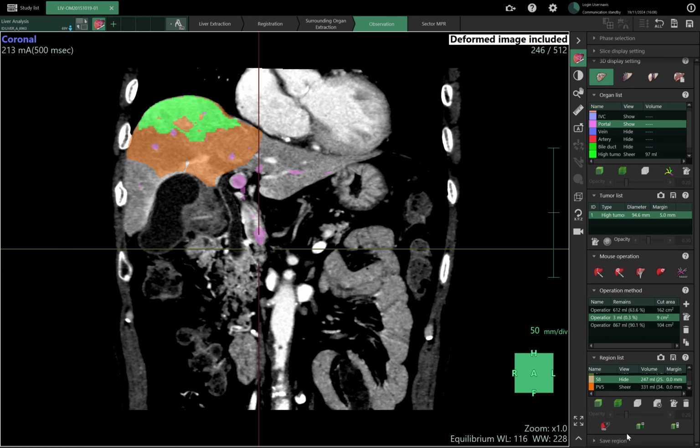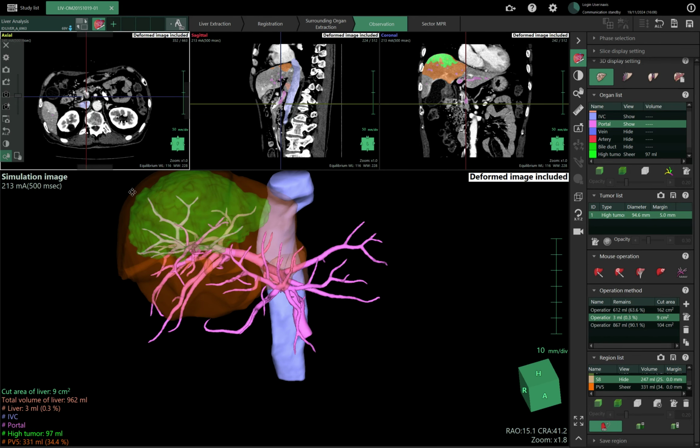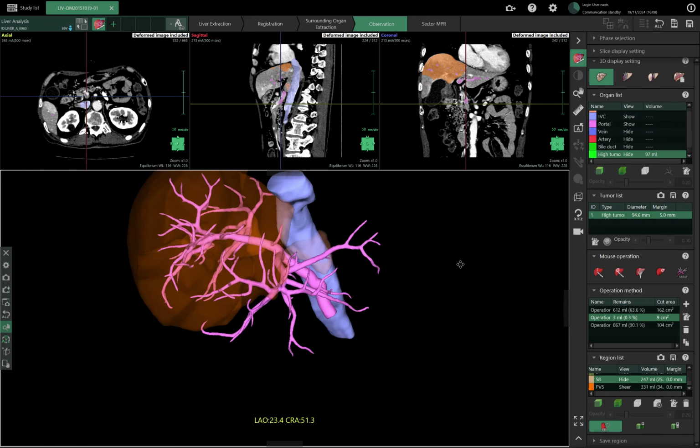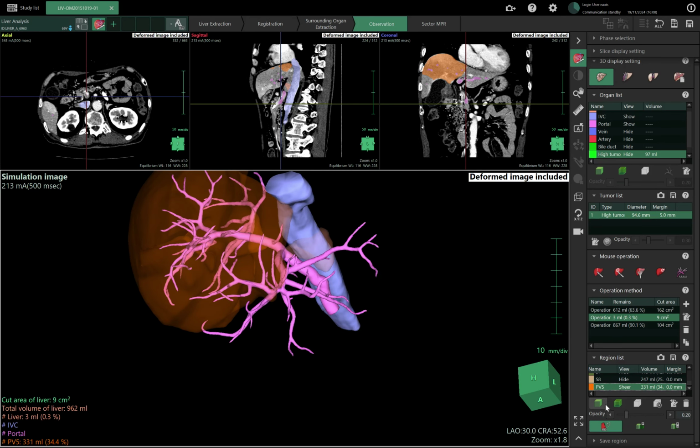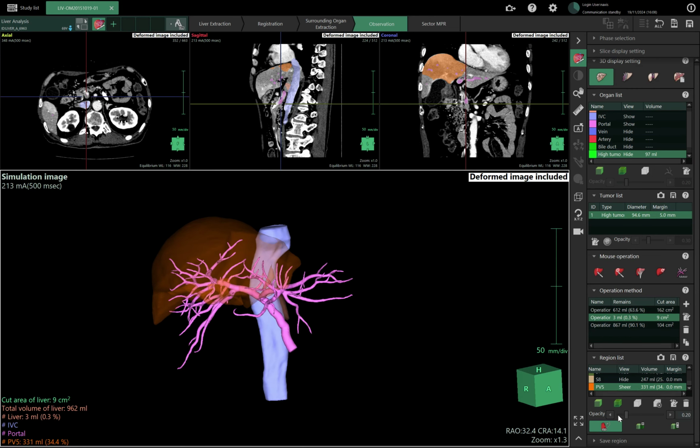Okay, so the rest of the application is more or less the same. This is just for matching the visualization of the tumor within the inside area. So if I set this to opaque or transparent, this segment 5 should be modified accordingly. So the display state of the tumor and the region should be applied together. The rest is more or less the same.